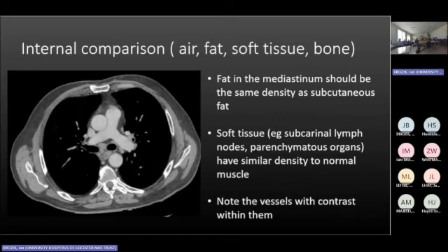For review of CT images, we use different windows. The previous one was a lung window, perfect to assess the lungs or air-containing structures. But to assess soft tissues, you need to use a soft tissue window, so you can see nicely the mediastinum, large vessels, lymph nodes, airways, but we can't really assess the lungs. We need to use a different window.